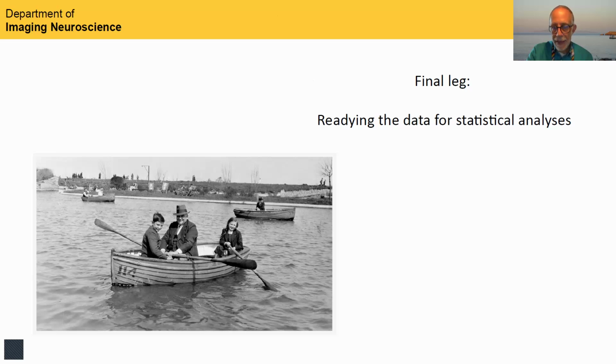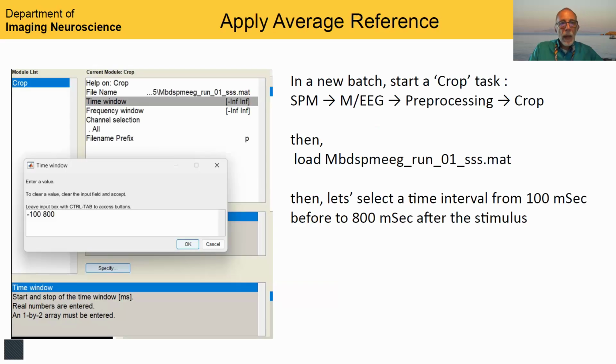So the final leg in this particular tutorial is going to be readying the data for statistical analysis. This is our final leg. And to do that, we are going to crop the data. This is just to demonstrate. Actually, it's beyond applying average reference that my slide says. We're going to crop the data.